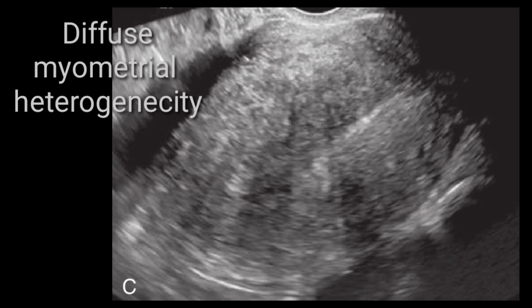So you have seen echogenic foci, echogenic striation. This would be one pattern. Another pattern is small cystic areas within the myometrial parenchyma. The third point is when there is heterogeneous myometrium itself. So this would be considered as adenomyosis.